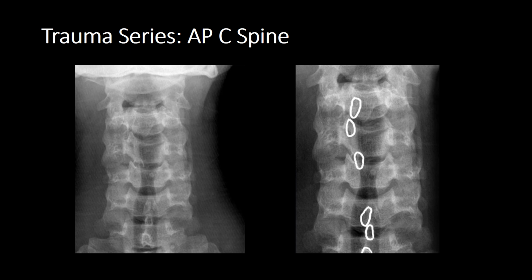Let's have a look at the spinous processes more carefully. So we can see a normal C7, and we can see that 6 and 5 are adjacent, and suddenly you have a marked space, and suddenly our spinous processes are rotated to the right. The side that the spinous processes are rotated to is the side of injury. So there is an abnormality to the right side causing rotation and malalignment to your spinous processes. And we'll come to what that looks like on the lateral spine in a bit. But in the meantime, always check to make sure that your spinous processes are in alignment.